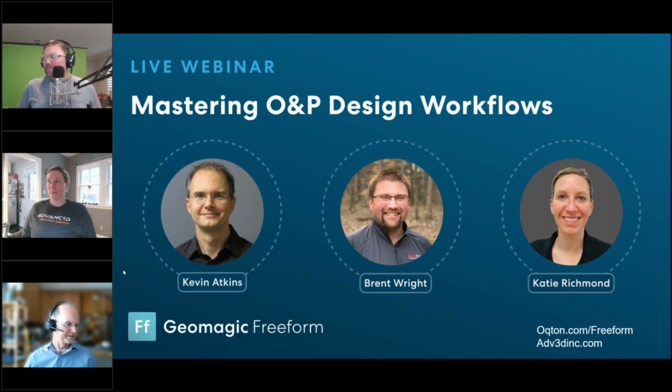Mike Silver's just put in another question for auto surfacing. Oh, neat. Just saying he uses the auto surfacing all the time and exports from IGES into SolidWorks. Yeah, Freeform will work with other pieces of design software very well. What Freeform does, it does very, very well. But if you're doing mechanical components, can you do them in Freeform? Yeah, but you can do them so much better in your regular CAD system.